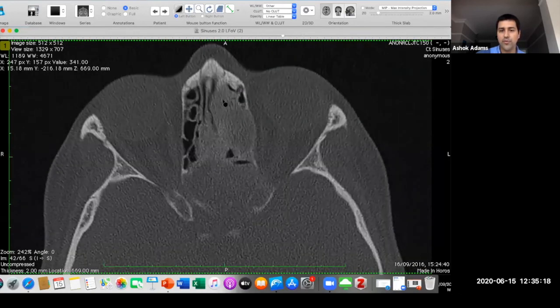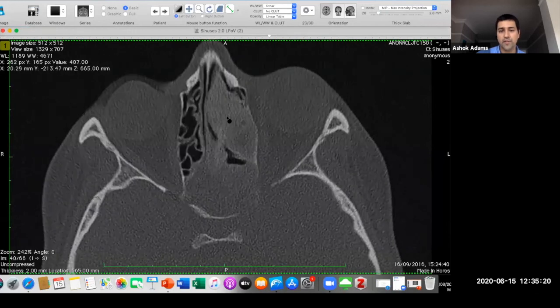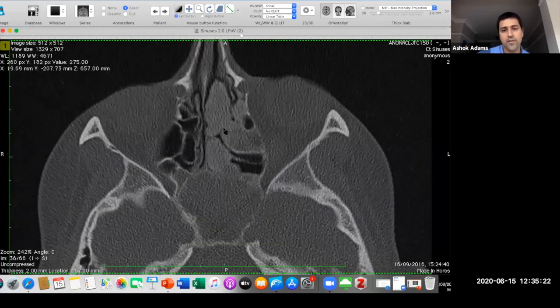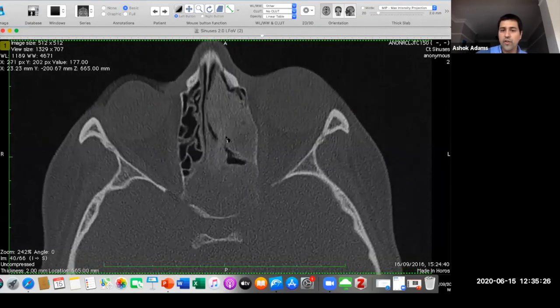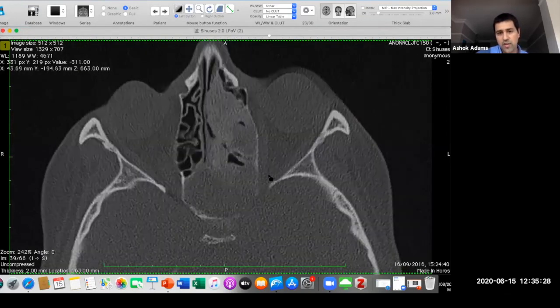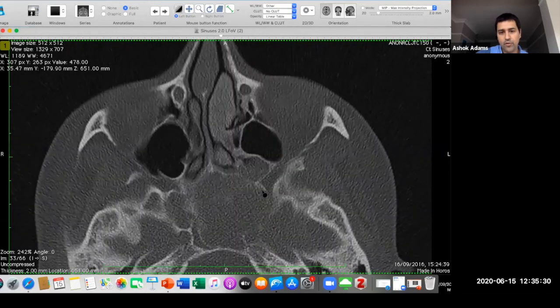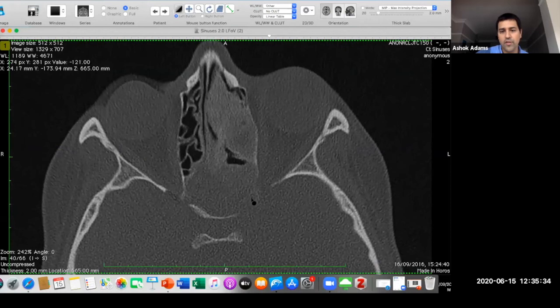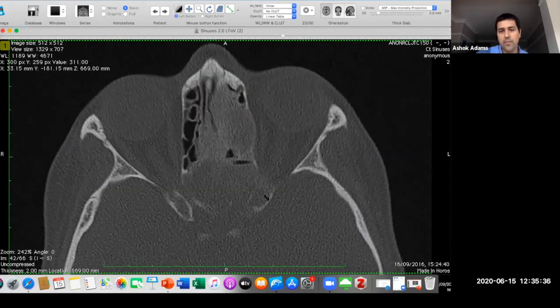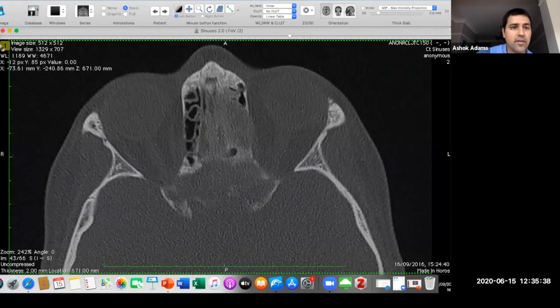They can often present with cranial nerve dysfunction, mainly because it can narrow some of the skull base neuroforamina. And it can look slightly odd, and often, particularly with visual symptoms, you can see how that problem was, unfortunately, she's had a decompression, but she lost vision in the left eye and has got poor vision in the right eye. But you can see how that can be explained by this intrinsic skull base process that was affecting the optic nerve canals. All right, going to move on.